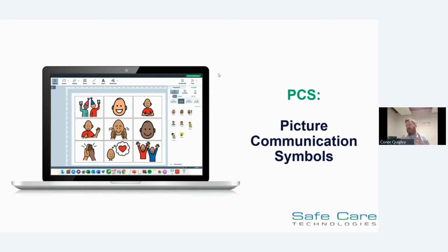I suppose for both TD Snap and Boardmaker, which are two separate softwares, the most common feature amongst both is that they use PCS symbols, which are picture communication symbols. If you work in classrooms, or you're a speech and language therapist, or you work with communication systems, you're probably familiar with these symbols, or you recognize the symbols on my screen.